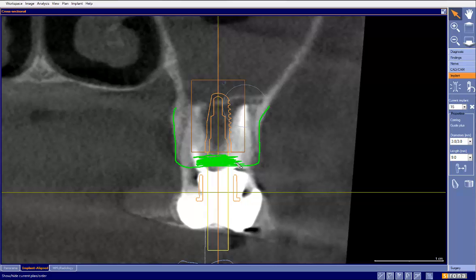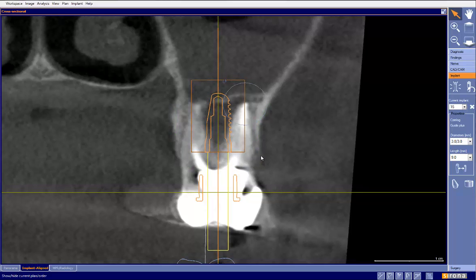So I want to have accommodation for that bone loss that's going to occur. So I would probably plan this implant to be about right here. The other thing is I would definitely go with a wider implant. And one of the negatives of the Camlog system is that it only goes to 4.3 in guided placement. And then I'm comfortable with 9 millimeters in length, but more ideal would probably be 10 to 11 millimeters in length. So now we've complicated the matter by needing to do a sinus lift at the same time to get ideal placement.